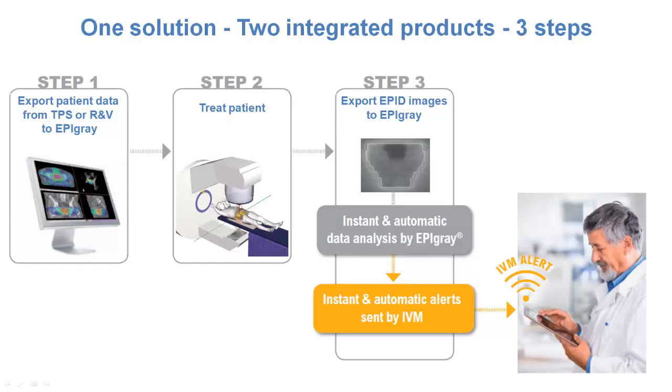It's a solution containing two integrated products, the web-based dashboard In Vivo Manager with an automatic alert system, and the Expert module. EpiGray offers a new way to monitor treatments without having to be at the treatment console. Let's see how you can, in only 3 steps, track a treatment using In Vivo Manager dashboard.